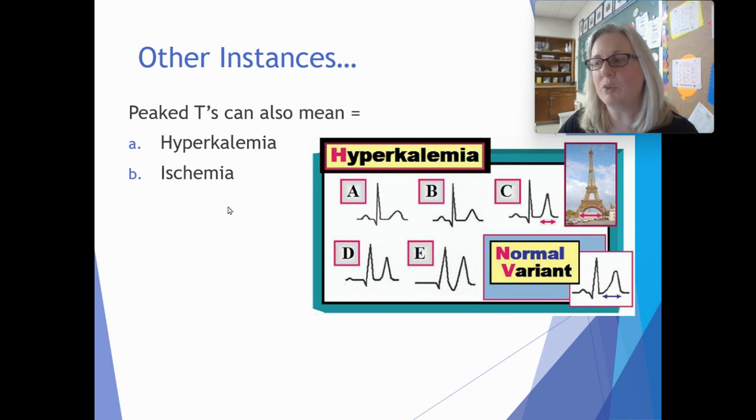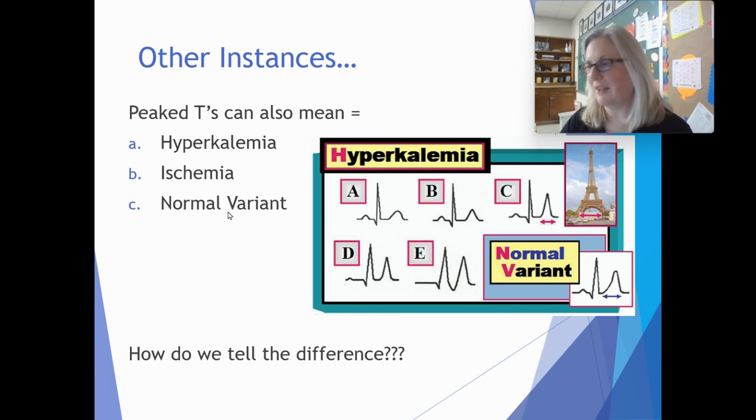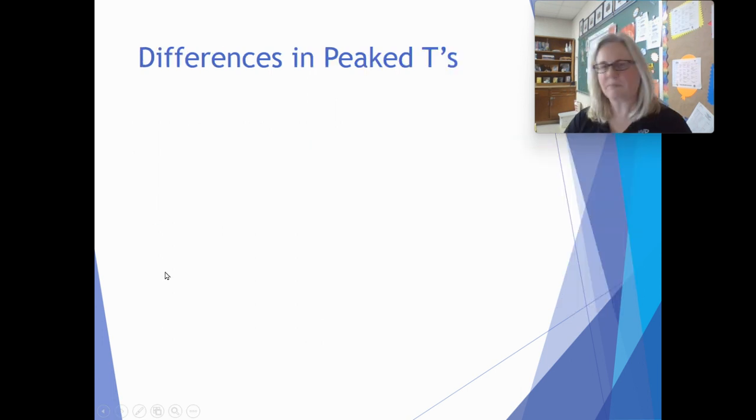It can also mean ischemia. It can also mean a normal variant. What? How the heck do we tell the difference then, right? How are we supposed to know? What's normal, what's hyperkalemia, what's ischemia? We're going to have to dig a little deeper. Okay, so let's go through this.